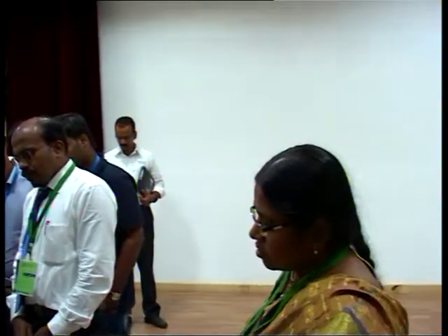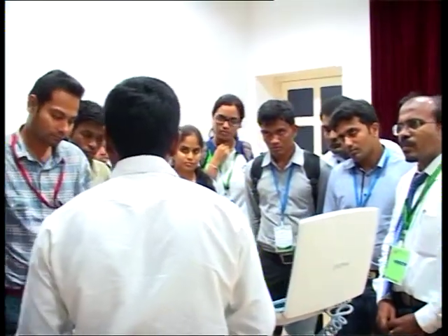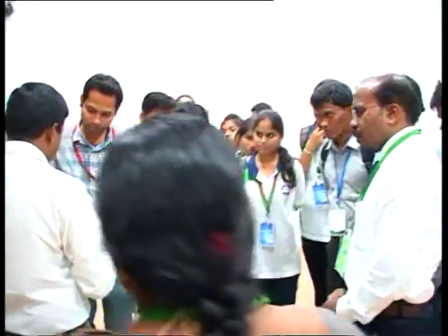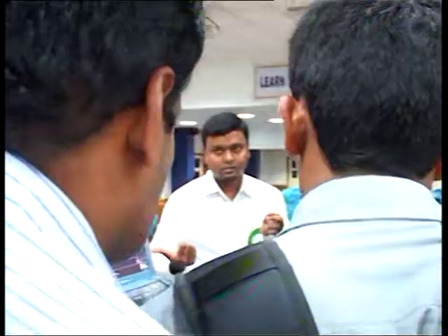This is actually a fiber optic technology. This is not a fiber optic. To measure the pressure, you need to use a transducer for monitoring. But for this machine and for this catheter, you don't need a transducer. Okay. See, in this balloon, there is a manometer. At the tip, you have a miniature manometer. That is the one which reflects your pressure and shows it on the digital display.